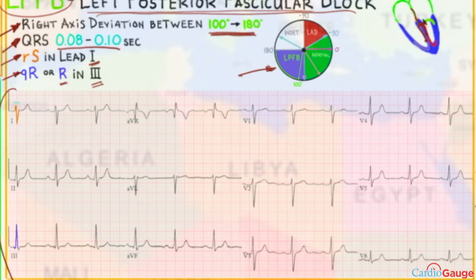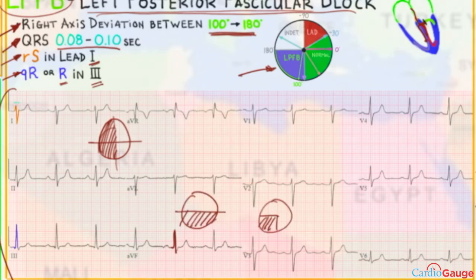So we're doing the axis, which is usually when this comes up. When you're thinking about the axis, 1 is negative, so we're over here. And then F is positive, so we're here. The intersection of those two is this quadrant here. So we're in the right axis deviation quadrant, and then 1 is actually quite negative. It's basically 3 little boxes minus 7, so it's minus 4, so it's really quite negative.